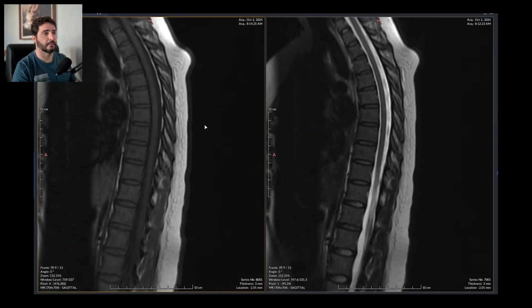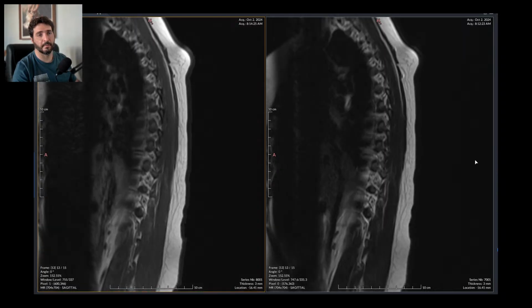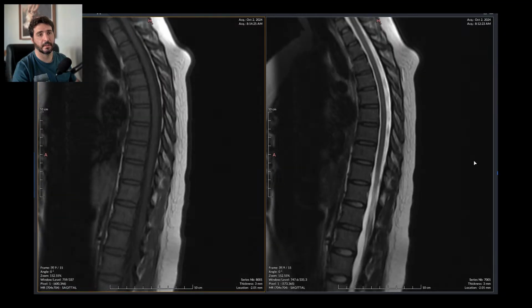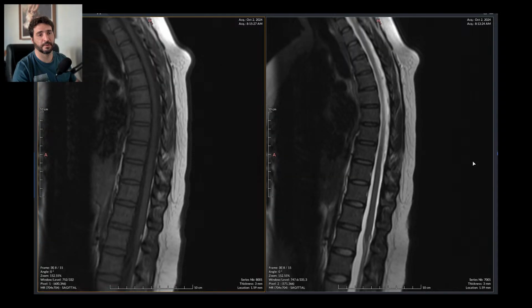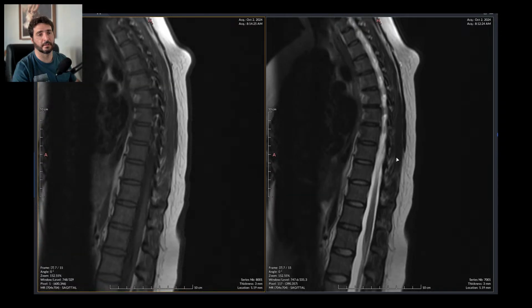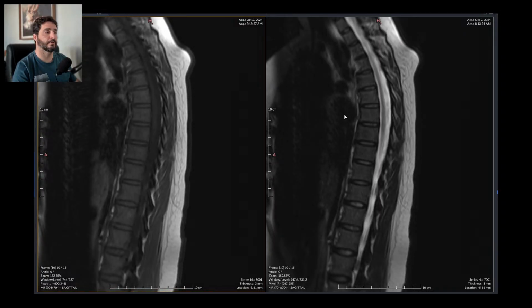It's done. We gotta report it. So discs are fine. Vertebral bodies and posterior elements are fine. Tiny portions of the rib cage, ribs are fine. The spinal medulla is okay, no protrusions, no extrusions, no tumors.